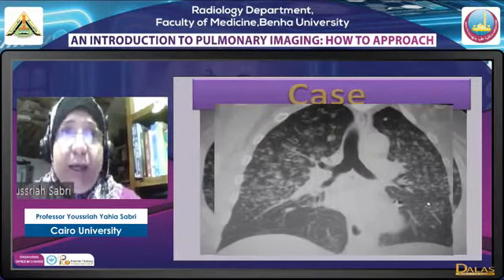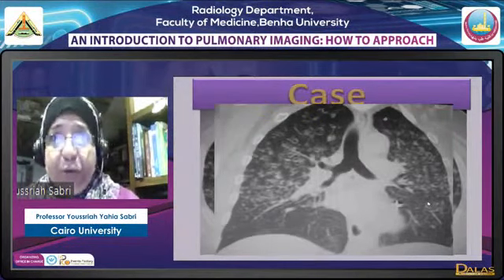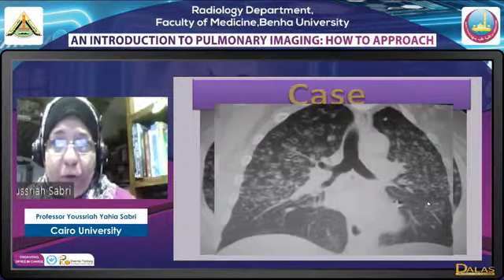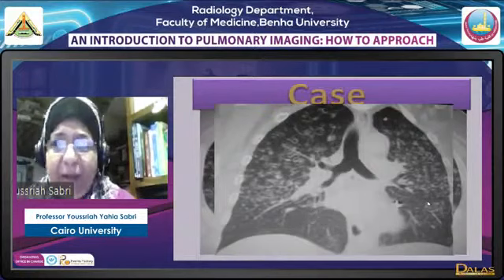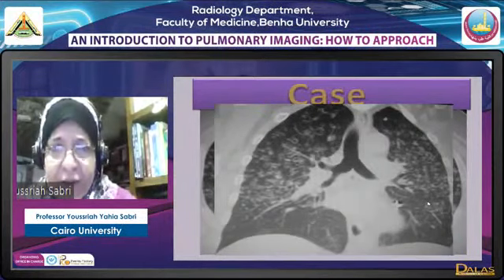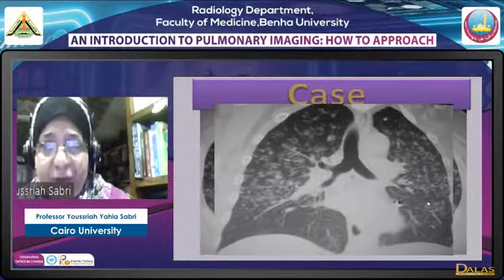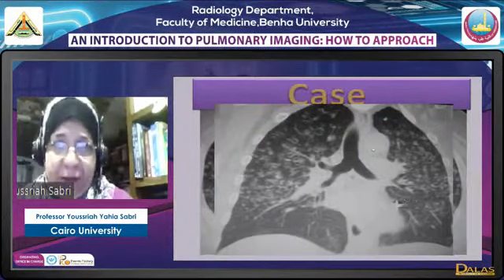This case was a case of pulmonary Langerhans cell histiocytosis. Pulmonary Langerhans cell histiocytosis starts by being nodules, okay, centrilobular in position, and then they cavitate and they change into cysts. We usually see them in the phase of being cysts, upper lobar cysts, rather than this early phase of nodules and cavitation.